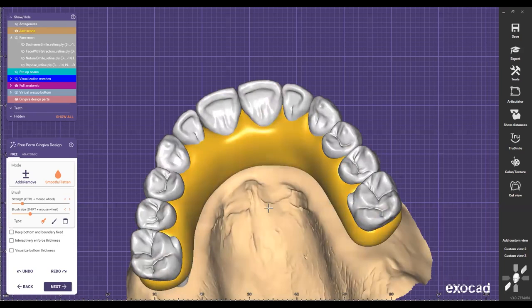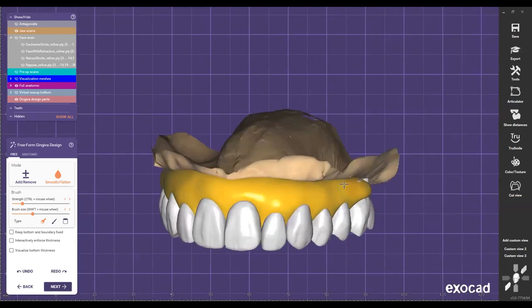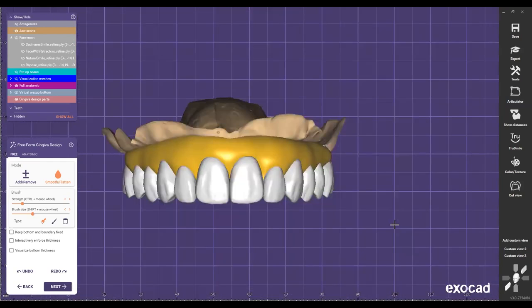So, I need to communicate this with the doctor so they know how much bone reduction I'm expecting when they cut. So they do it. But usually we have the CBCT here as well, so that way we can see if we're going to have enough bone there.